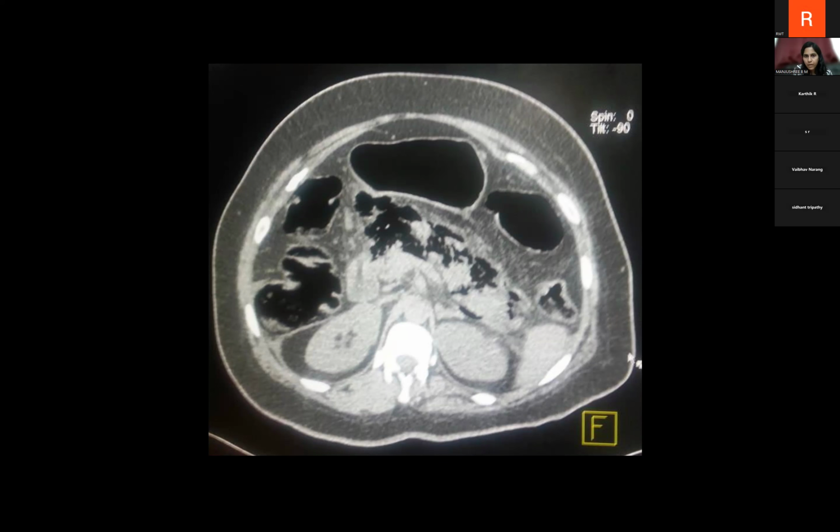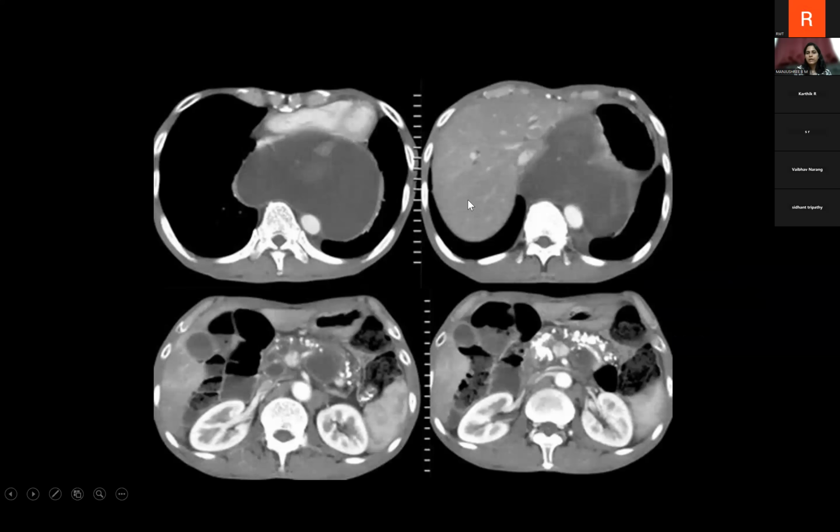Why not stomach herniation? This is not stomach herniation because we are already able to see that the pancreas is showing pseudocyst. Obviously, when we see continuous sections, we'll be able to say with confidence. But when we are given sections like this, there should be some reason, right? So when the pancreas is showing pseudocyst, we should correlate that with this lesion rather than herniation of the stomach.